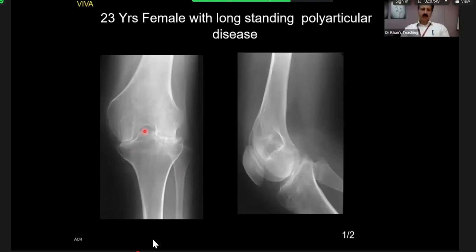What's happening to this? So that's the widened intercondylar notch. Okay, so conclusion. This is a 23-year-old female. In summary, these findings would be in keeping with a history of either juvenile idiopathic arthritis or a history of haemophilia. Okay, so female haemophilia? No, male.